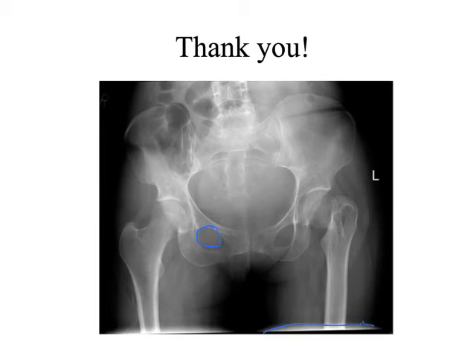What else is going on in this image? Well, that looks like a digital marker, but if you're saying it's film, it's not. It's possible, yeah, I noticed that too. That does look like a digital marker. Maybe it scanned an image to the computer. Yeah, we used to do that back in the day. In all honesty, shoot a film and then scan it into a computer, and add digital markers. I'm not sure. Maybe it's just shot on a digital system. Most digital systems that I've seen, it's difficult to capture fall off radiation. It may just be the way it masked it.